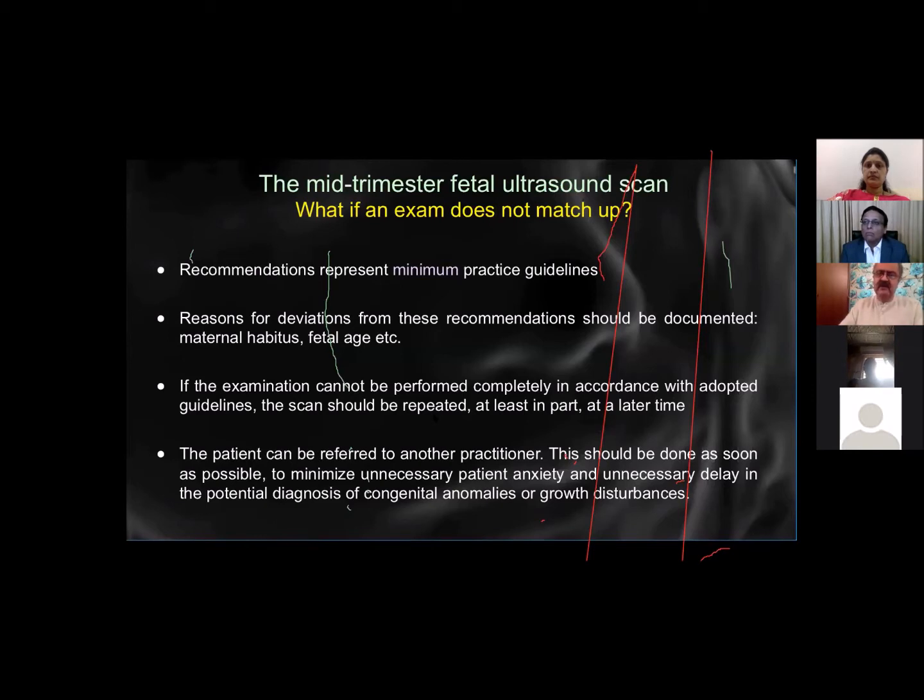That's what I do, that look, the visualization of the cavum septum pellucidum was inadequate. We cannot exclude an agenesis of the corpus callosum, and a revaluation is suggested at 22 weeks. And this has been scheduled with the patient for such and such a date. I like to mention that all in the report, and then we mention it in the conclusion as well, so that there's no misunderstanding. A patient may choose not to come back, or a patient might change town, and then tomorrow you hear from their attorney that, look, something has gone wrong, which is not nice. After we did our best. So it's nice to document all this and not just talk to the patient about this.